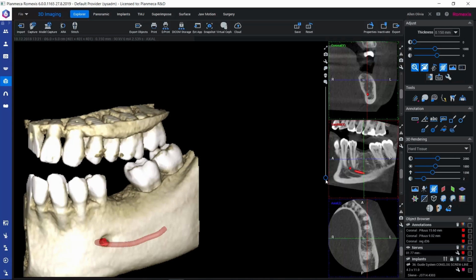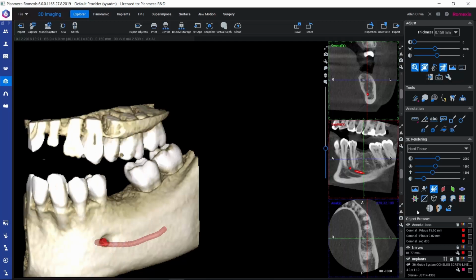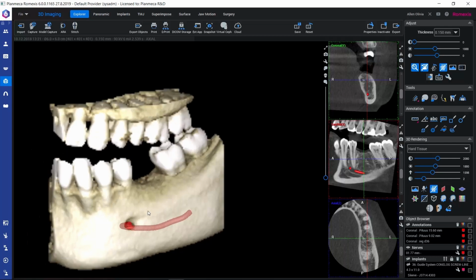This slider here is for seeing through the volume or seeing what's inside, but this is actually covered together with this clean rendering tool and normal volume crop tool in a separate tutorial about cropping the volume.